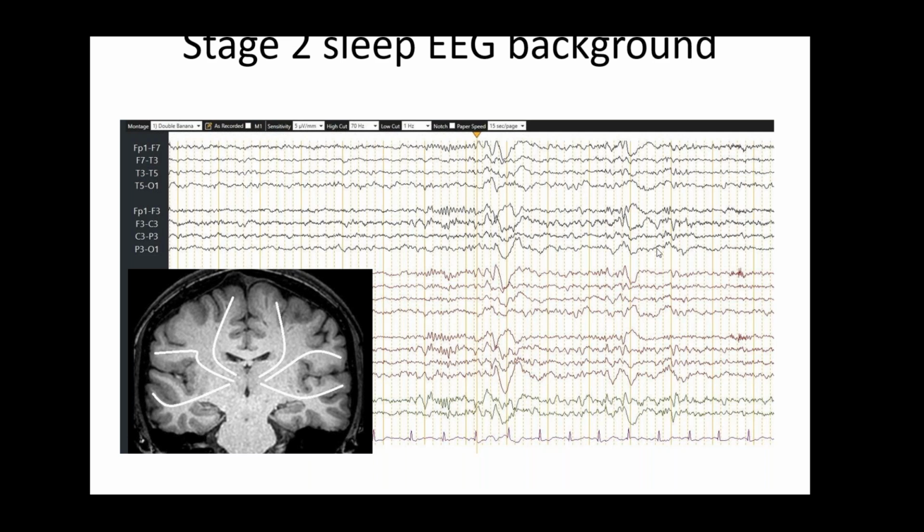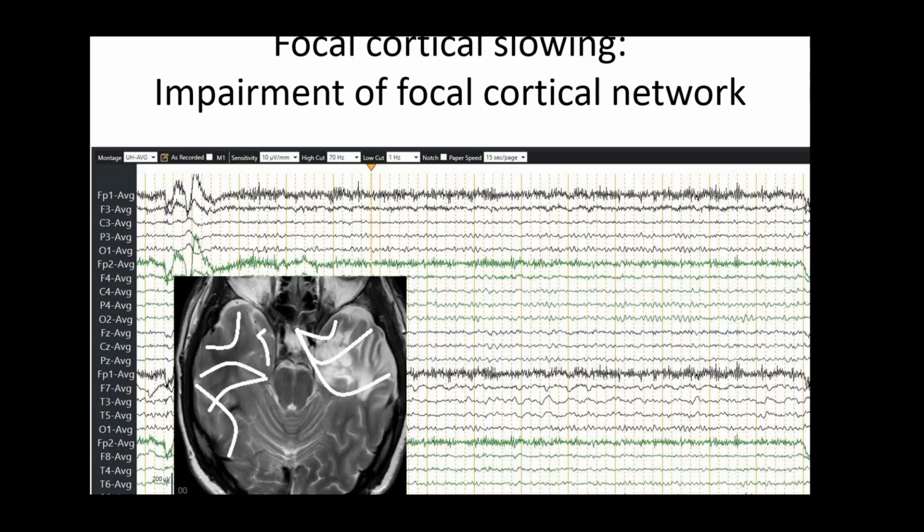Okay. So by looking at the EEG, you know the patient is awake, you know the patient is asleep, and obviously then you start looking into abnormalities. So this is all normal EEG. So now what happens when you have something wrong with the brain? I'm going to give you an example. You have a lesion in the temporal lobe. There's a mass lesion there.